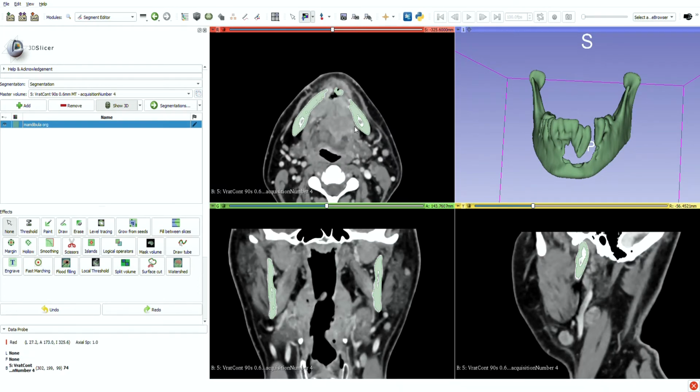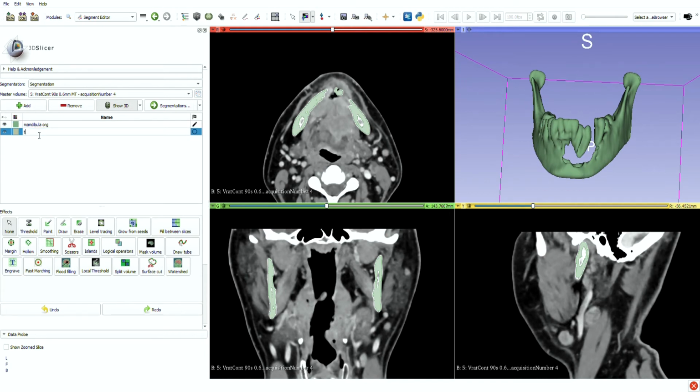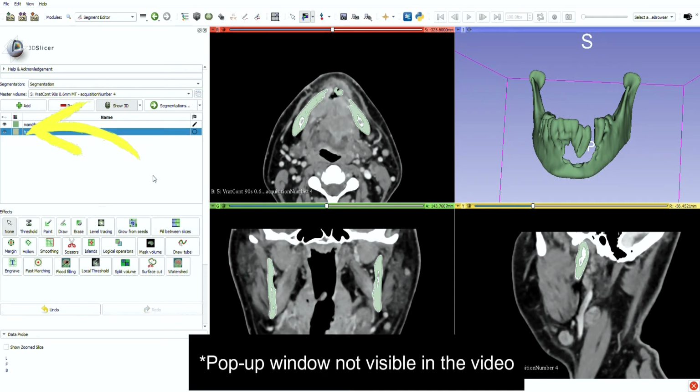Okay, now you can stop if you want, but just as a showcase, I'll segment a tumor of the patient also, but it is not of importance for this procedure. Over here you can change the colors if you want. You can search here and write.